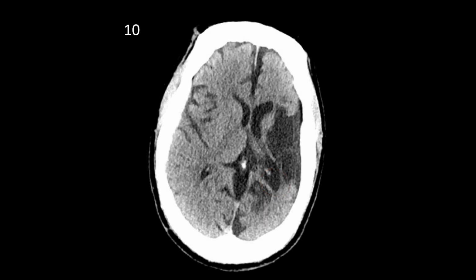As progressive tissue breakdown occurs, the affected brain parenchyma will become increasingly more hypoattenuating, sometimes approaching the attenuation of cerebrospinal fluid. This tissue loss is known as encephalomalacia, and the loss of brain volume results in the enlargement of ventricles and sulci near the affected area. This ventricular enlargement is known as ex vacuo enlargement.